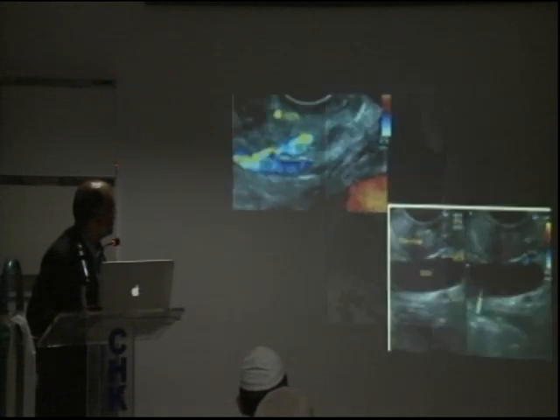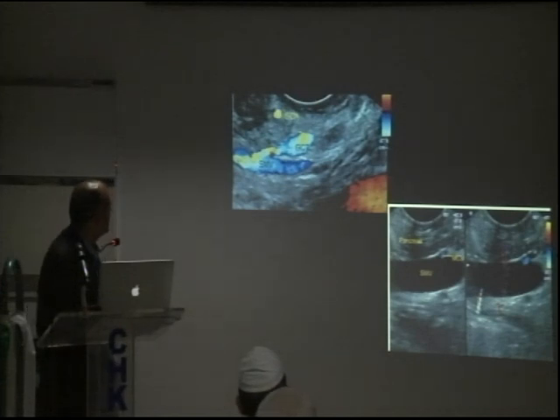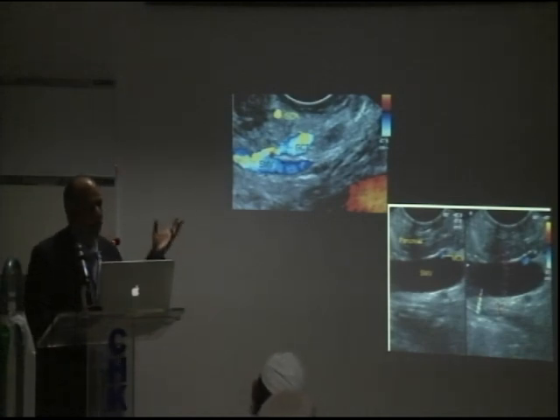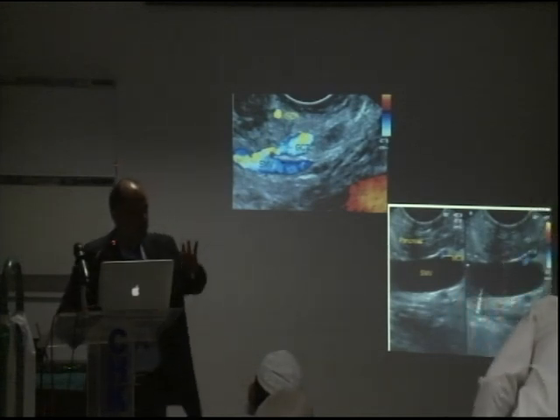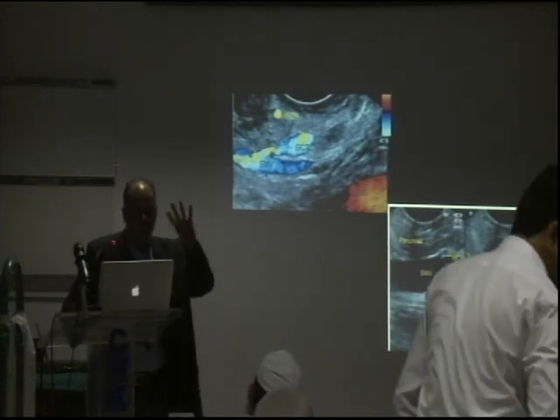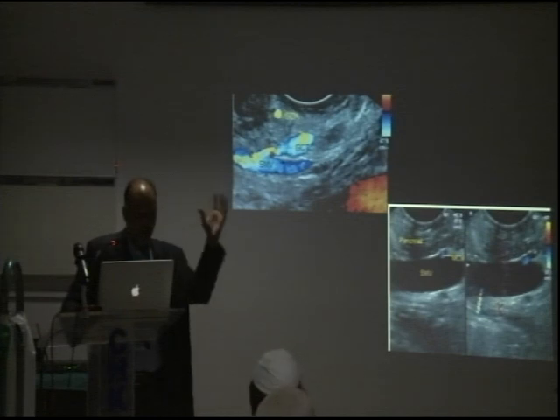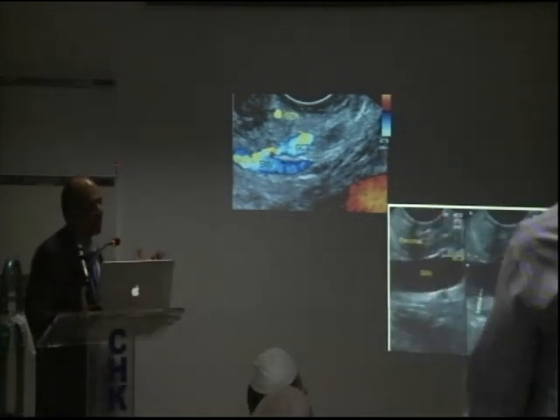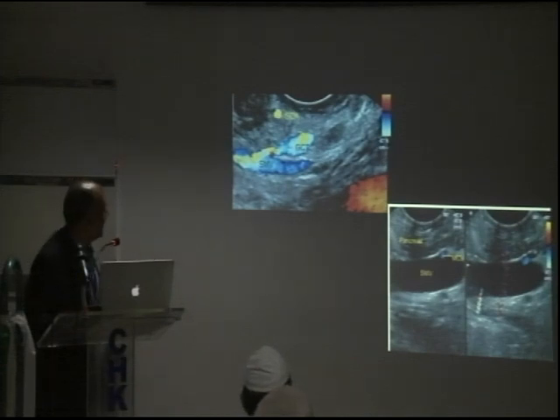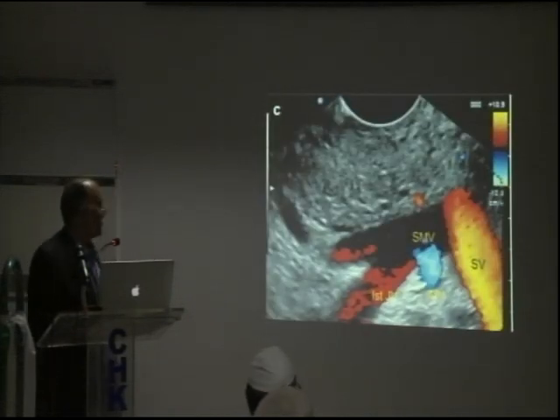I think I will not confuse you there. Okay, again, any idea? Where's the head? The exercise was here. What I meant to do was that you should be trying to mentally flip the images, and you should be able to do that. But that's the point. You don't have to get confused by that. All right. Where are we?